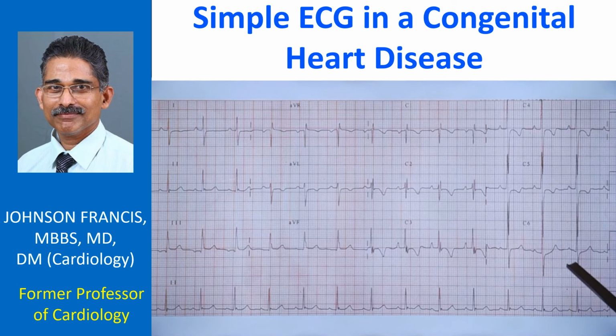That was the reason for biventricular hypertrophy pattern in ECG in this case. Double outlet right ventricle with ventricular septal defect. That will appear almost like a VSD with large shunt, and there was pulmonary hypertension.